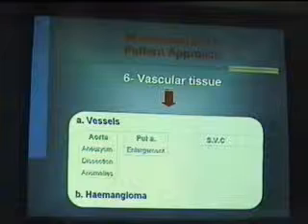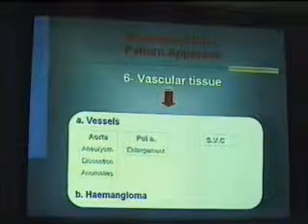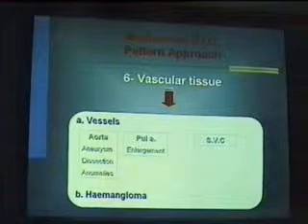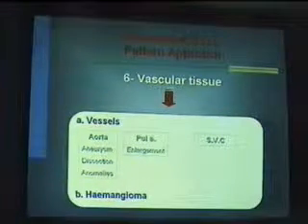Or we have a pulmonary artery enlargement due to pulmonary stenosis or in cases of congenital heart disease و superior vena cava problems هنشوفها مع بعض بعد شوية، أو tumor زي ما قلنا arising from the vascular tissue.